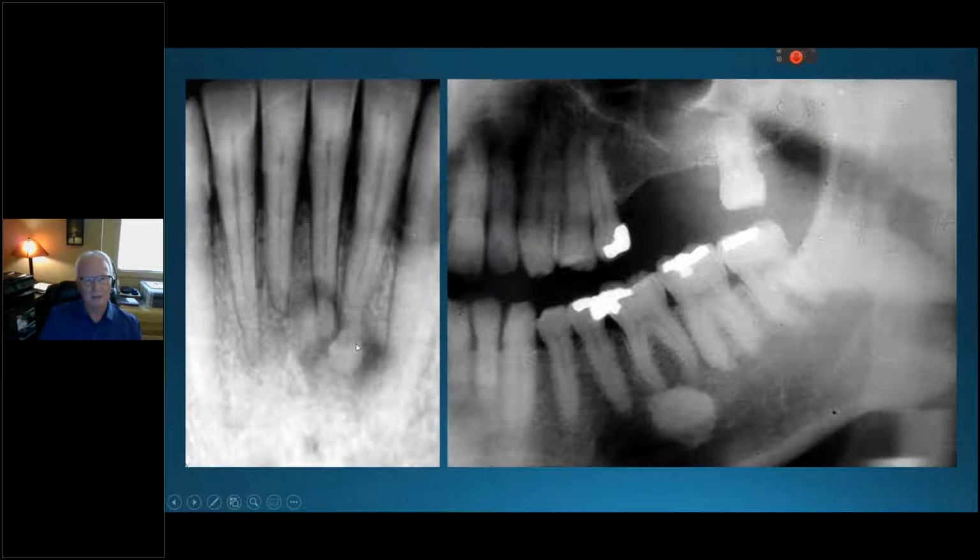In the next image, on the left, the periapical view of the central incisor shows a radiopacity surrounded by a large radiolucent rim. You can make out most of the periodontal ligament space. This would be an intermediate stage lesion. There isn't always a lot of distinction between intermediate stage and mature, which is the last one. These probably would both be intermediate stage because you can see a ball-shaped opacity and a radiolucent region around it.